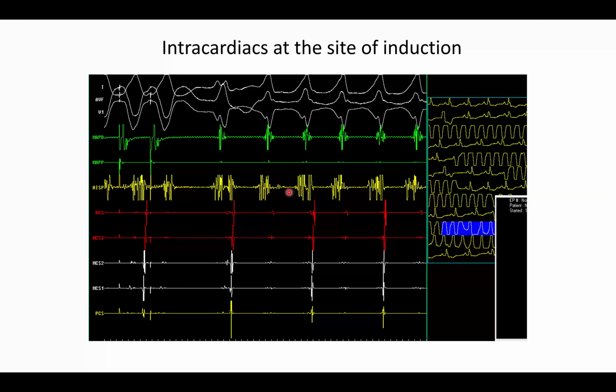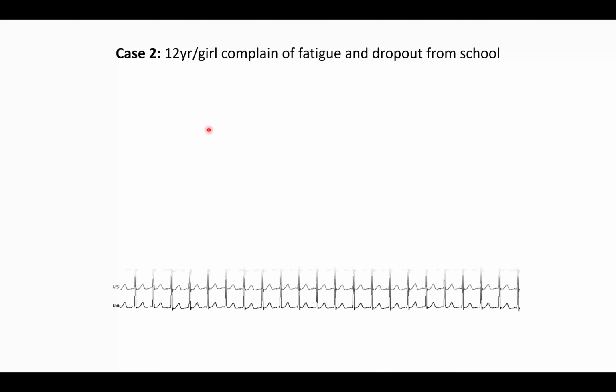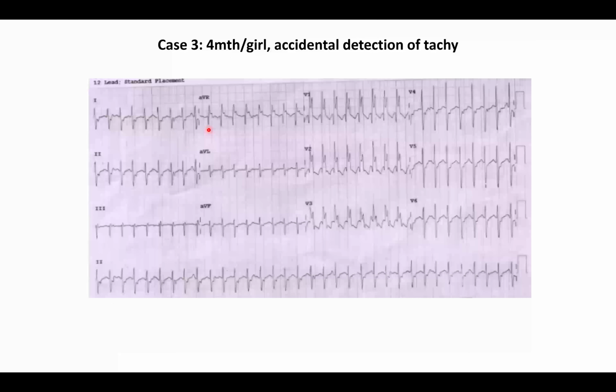Second, it's a negative HV tachycardia, right? We discussed that anything which is negative HV tachycardia, which is V's more than A, is a ventricular tachycardia. This is an example of ventricular tachycardia induced in the electrophysiology lab. This I'll skip, but I'll show one more interesting case before I stop. This is a nice case to discuss.